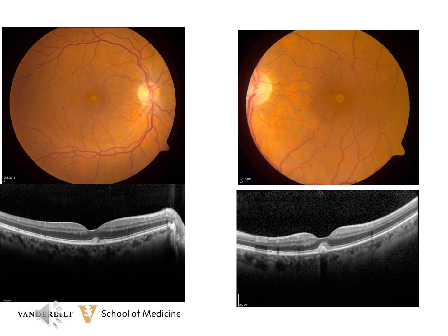This is our second example that we gave clinically of the vitelliform lesion with the dark pigmented center. This is a more modern OCT, and you can see the same hyperreflective material above the RPE and below the ellipsoid zone.